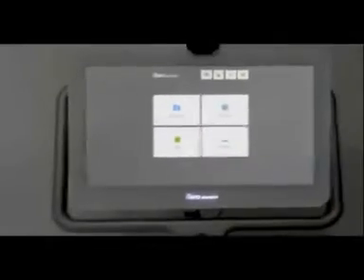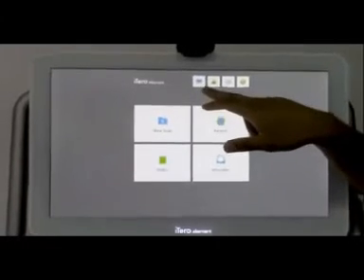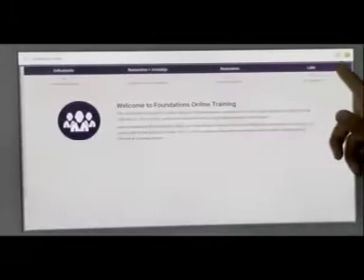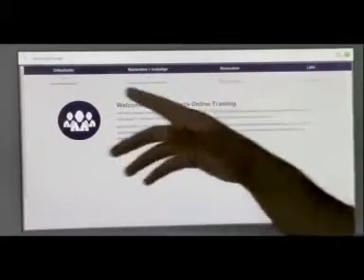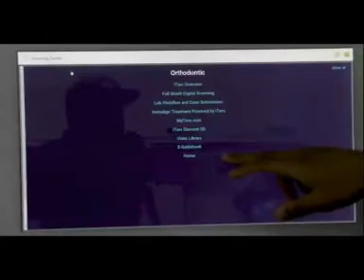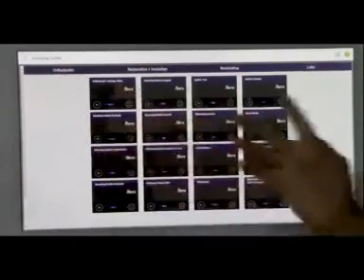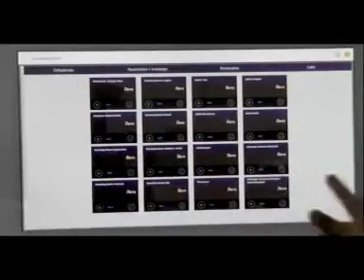So to start, let's just understand the home screen. Along the top, there's an education tab that you can tap. It goes into the learning center, and then you choose a language. Along the top, it has different topics, so orthodontic, restorative, labs. Let's go orthodontic, and then you can go to the video library, let's say. All the features of the iTero are here, where you can learn.